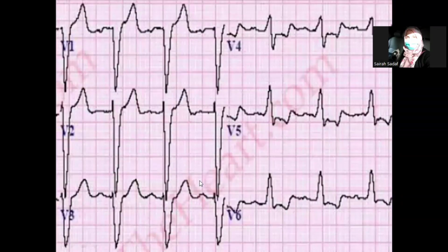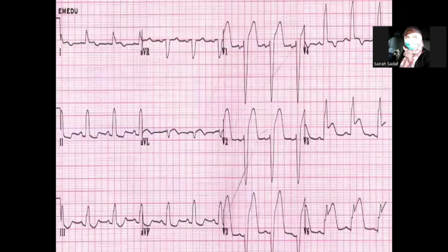Okay, now what is this? This is very clear now. The normal features, but enhanced. Broader, taller, deeper. This is LBBB. Yeah, everyone, this is LBBB. Good. Okay, now what is this? Now, next slide.